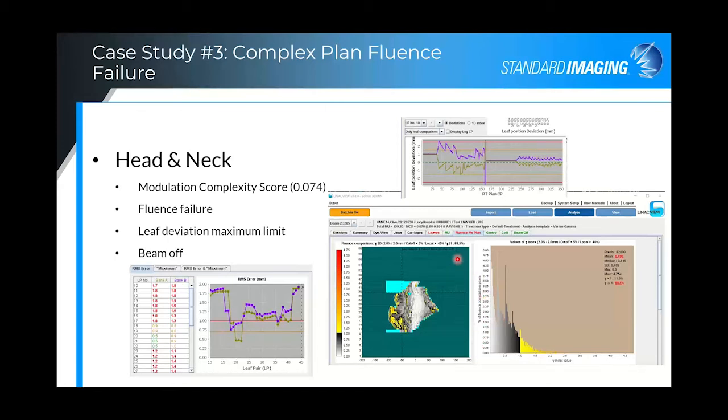It's color coded, so it's easy to go straight to the errors. This is the tab, you have information and it's color coded. This is what you're monitoring: the beam off, collimator, gantry, fluence versus plan, MU and leaves. The ones that pass are in green and fail in red. So you can just hone right into the area that you need to review.